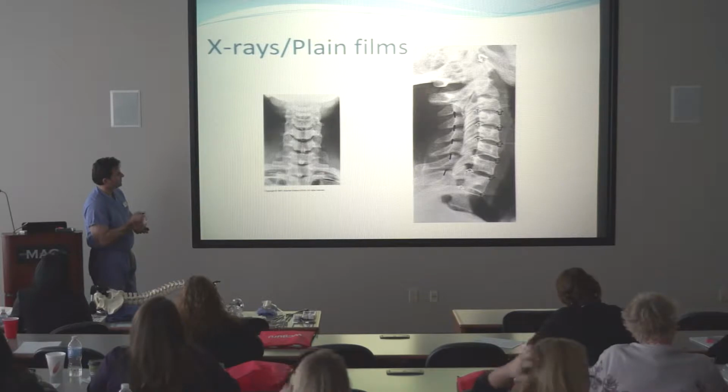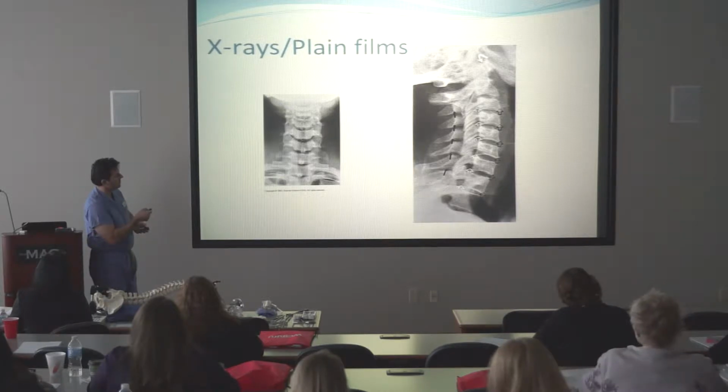In the front here, same sort of concepts. We're looking for the spine to line up, spacing between the bones is the same. Spinous processes are all in the midline. That there isn't a rotational issue where you'll see one spinous process sitting way over here.